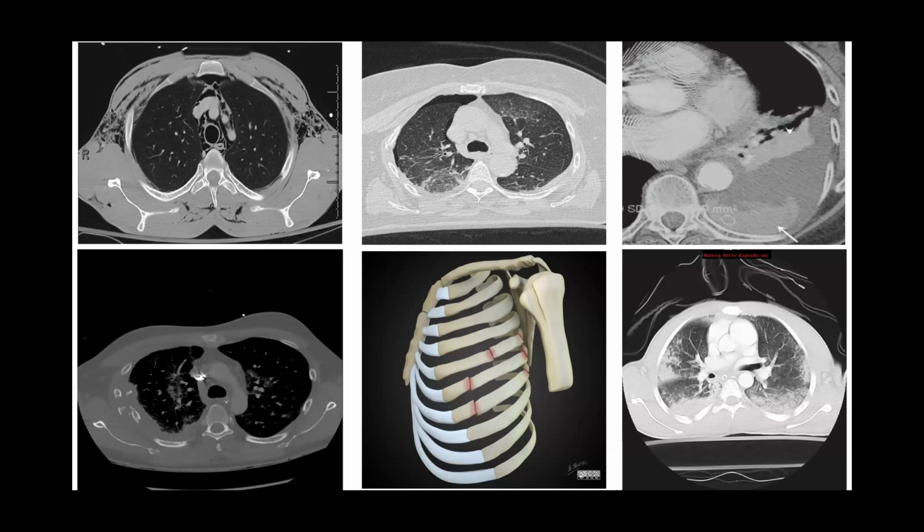So this is a multiple CT trauma patient. So let's start with the first one. You can see there is extensive air within the mediastinum structure. This is called pneumomediastinum or extensive pneumomediastinum. Also, there is air within subcutaneous soft tissue. So this is called subcutaneous emphysema. The second picture, there is air within the right lung pleura compatible with pneumothorax.